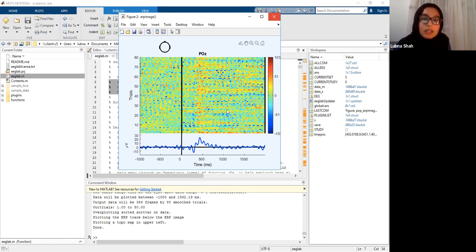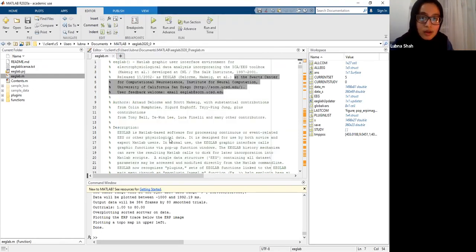So what's recommended is that you increase the smoothing factor. If we increase it to 10, you'll be able to find the specific potentials, or where high potentials or low potentials are going on in the data, for example. So I'm going to show that real quick.